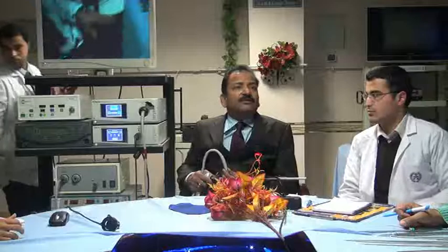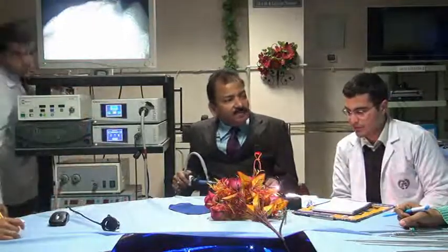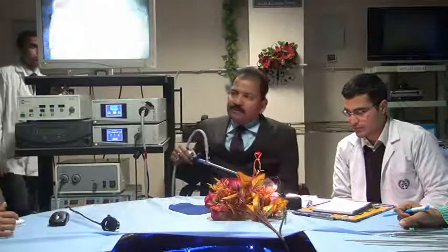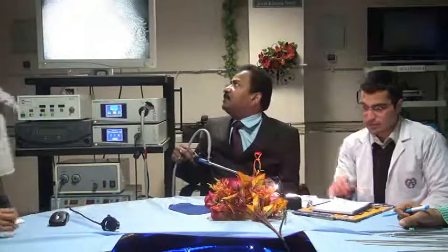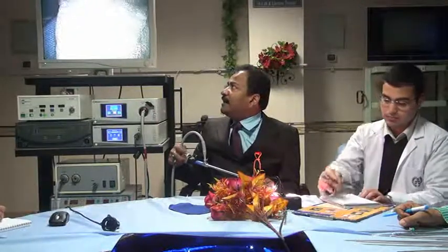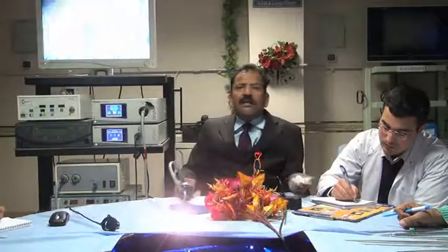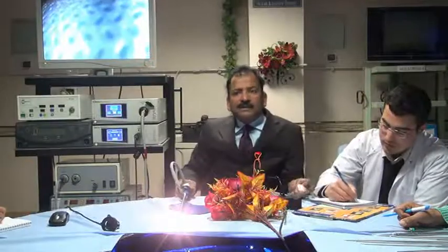For a 10 mm telescope, focusing at 10 centimeter; 5 mm telescope, focusing at 5 centimeter. This is the focal length of the telescope, which is fixed. Now, the question is why they are fixing the focal length at 10 centimeter? The reason is that at 10 centimeter distance, you have 40% absolute anatomy and 60% relative.